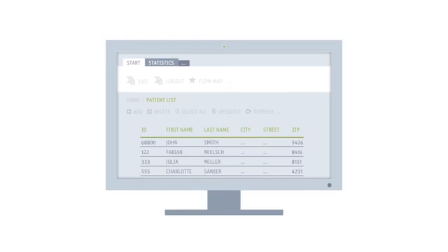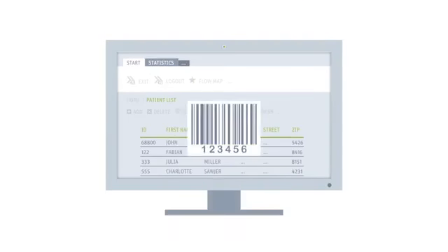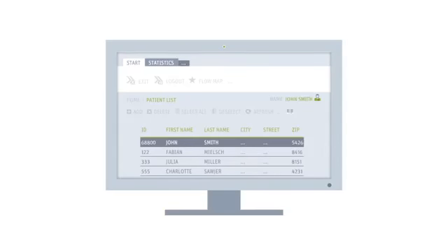First, we are going to take a look at the workflow when there is no previously created order. In this case, the user will go to the patient list and then select the patient, for example by scanning a barcode into the search field, or by entering the patient's name. The patient's name now appears in the upper right corner of the window. In addition, the ribbon bar displays two more tabs: the patient file and medical software tabs. Clicking on Medical Software will open a bar that contains icons for all devices connected to the MediConnect system. The user selects the corresponding device by clicking on it.